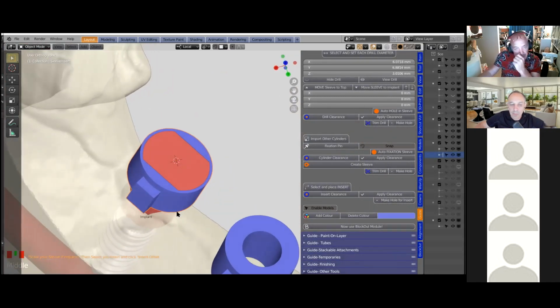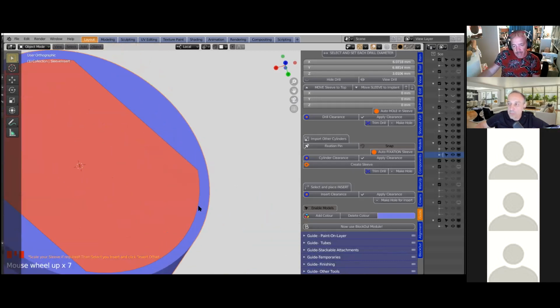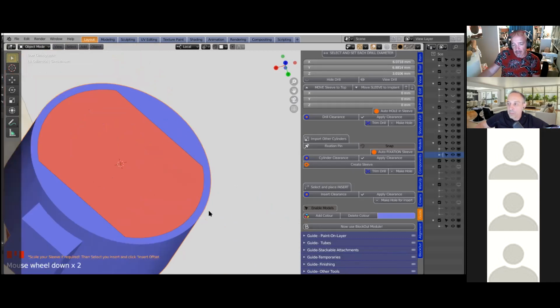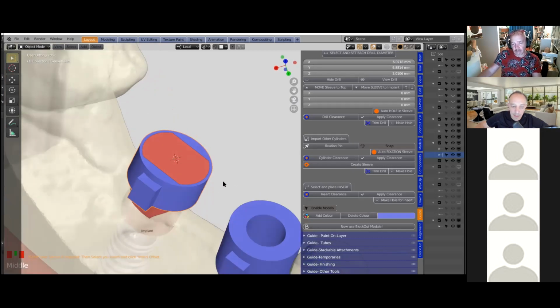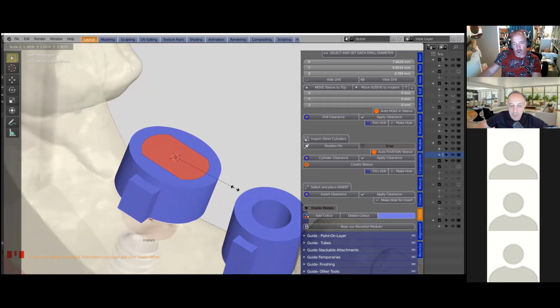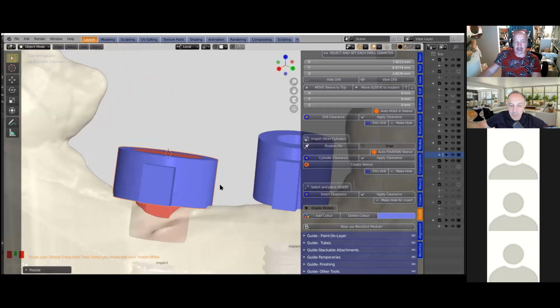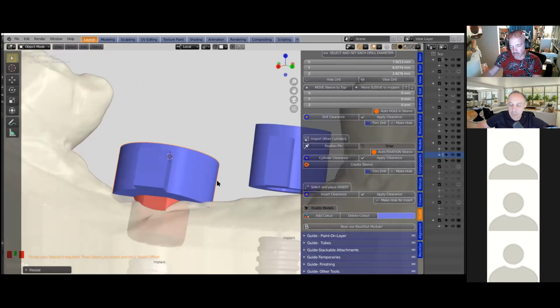Notice now, please, that if we cut this and you want to print something this thin, good luck, because we're looking at like 0.2 or 0.3 millimeters. So be consciously aware that we have to then put a little bit more plastic. It's not critical that it has to be 1 millimeter or 2 or whatever. Make sure it's sort of 0.8. You get the feel of it very fast, how these dimensions work.